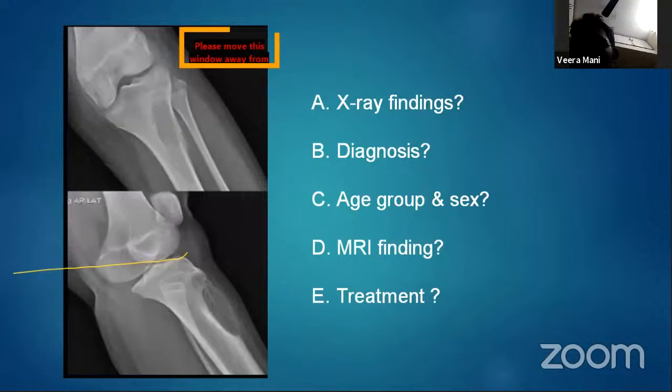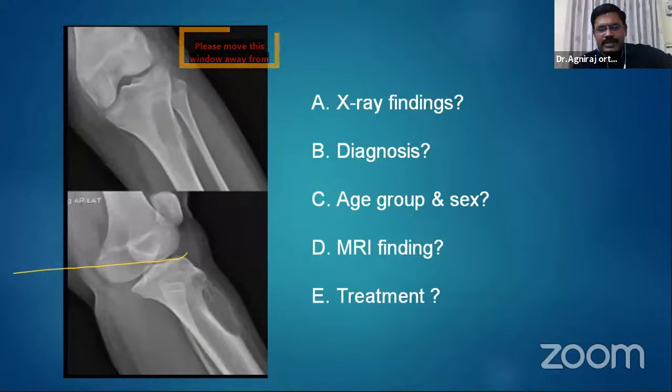Sir, simple bone cyst, sir. Is it a common site for that? It's not common, but a benign lesion. Veeramani, please go through carefully what you have said. The diagnosis is in what you have said. It is very simple; all the findings are told correctly. Simple bone cyst cannot be the first diagnosis. I cannot accept that as the first diagnosis.